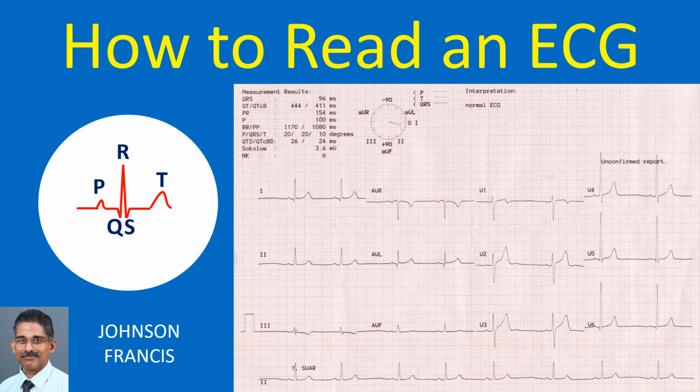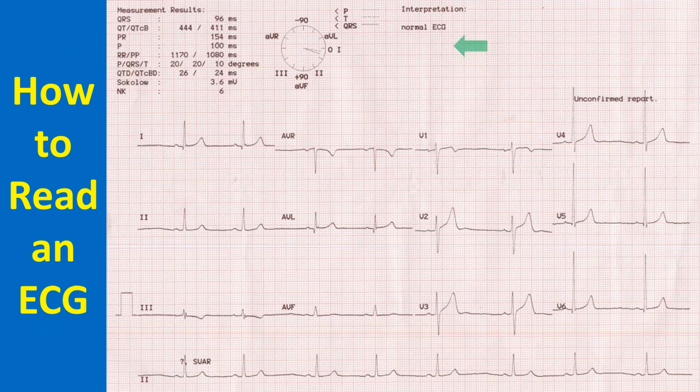This video will guide you through the systematic interpretation of an ECG. Nowadays, most computerized ECGs have a report printed on it, but it is our job to check whether it is correct or not in the context of the clinical history.